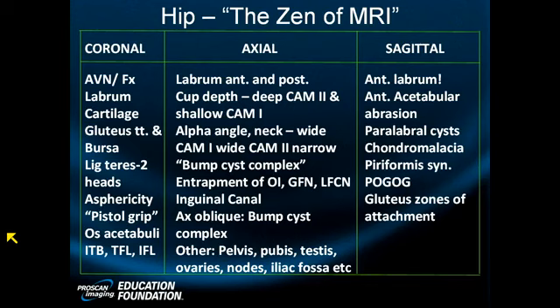Now, it's not round. It's not conical. It took the radial to show this lesion. It's in the mid portion, the mid-medial portion of the hip. It's a pretty atypical position tear, but there's swelling near and around it, and it is through and through. Now I'm showing you one of the hardest ones I have. It's proven. It got arthroscoped and it got repaired. And she has all the secondary signs that support the diagnosis of cam-type impingement. Oh, this is a tough one. So it took the radials to make the diagnosis.